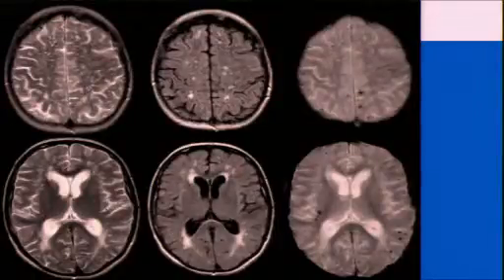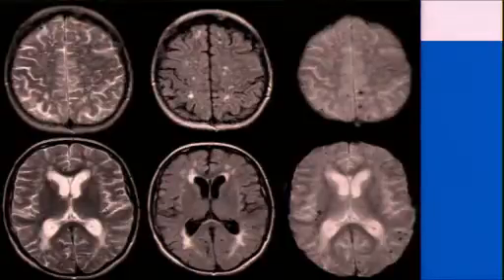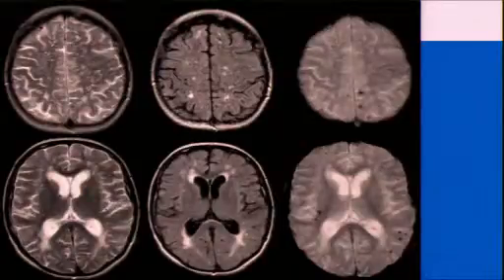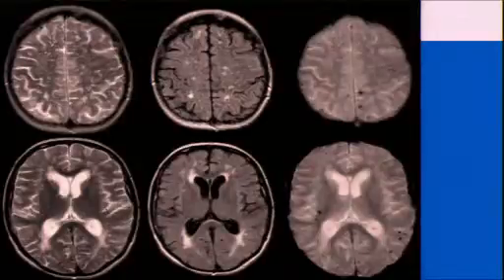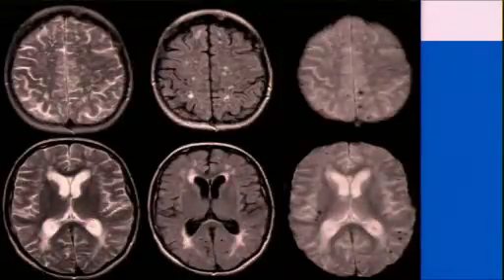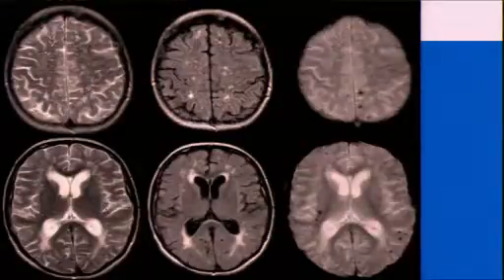Amyloid is deposited in the subcortical white matter, mainly in early Alzheimer's disease stages. And then there's an angiopathy which can be triggered by that amyloid deposition. And so the small vessels become weak, and we do see small hemorrhages. So it's not a mass bleeding, but small microhemorrhages, which we can see. And that's a dilemma in patients that have hypertension, that have small vessel ischemic changes. They probably have some other vascular changes.